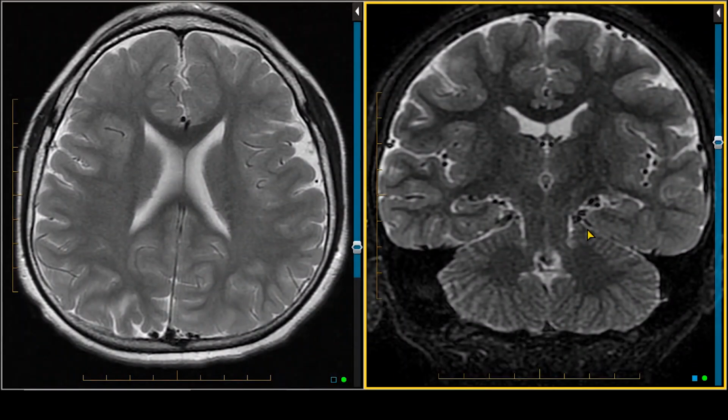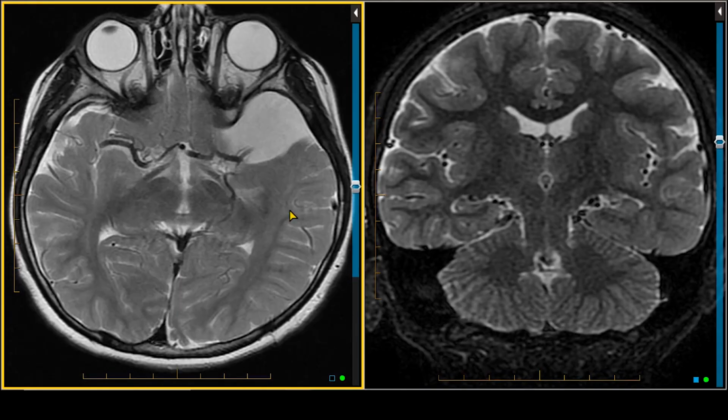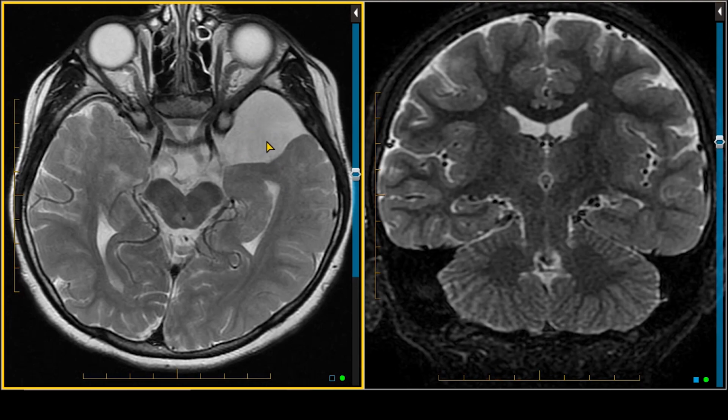This is an MRI scan in a 7-year-old child with headache, and at the level of the body of the lateral ventricles, there's normal symmetry between both cerebral hemispheres, and everything looks okay. If we go inferiorly, we see this prominent area of bright signal on T2 weighted imaging.